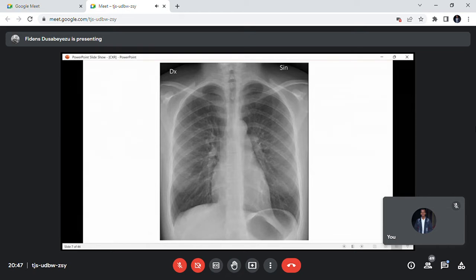The posterior ribs are not as difficult as the anterior ribs, because for the anterior ribs there are those rules. You have to go to the mid-clavicular line, crossing above. But for the posterior ones, the only problem is the first 3 ribs, because if you look very well, they are somewhat superimposed posteriorly. Like this is the first rib here. You should check the ribs from anterior, from the first and the second, to know what is at the first, second and third posterior ribs.